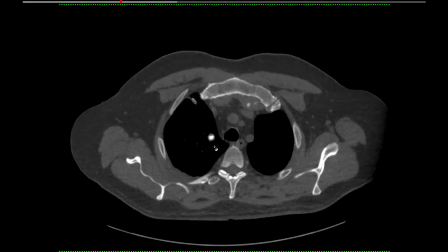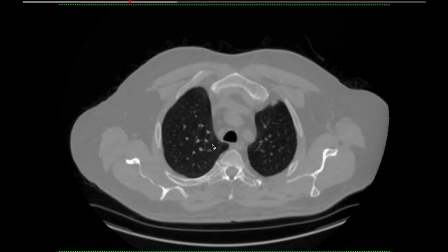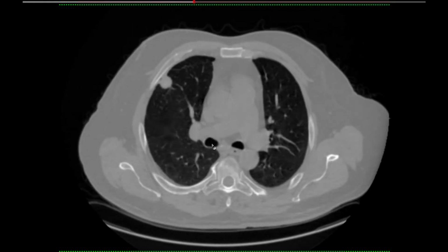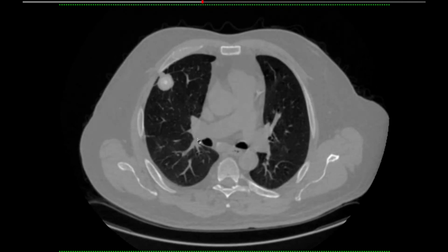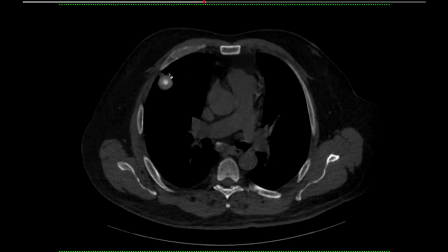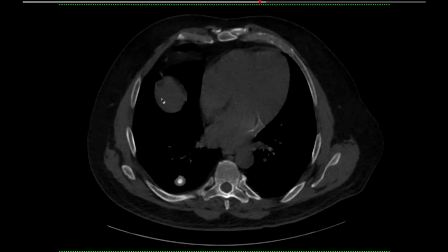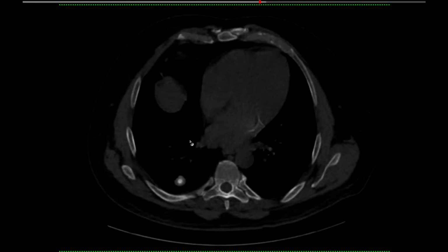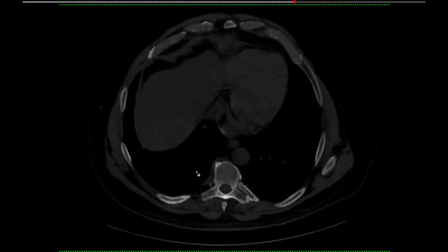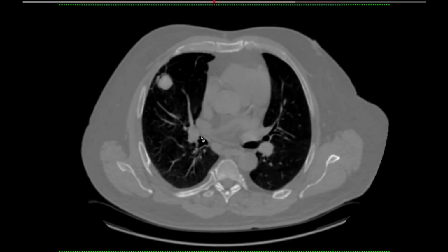Okay, so I'll show this case first because it has nothing to do with the other ones. I don't know why my PACS always exports only the lateral. You can see some nodules here, but the CT is what's kind of cool. As much endemic fungus as we have in the Midwest, we don't see a ton of histoplasmomas. This was cool because this patient didn't have one, but multiple. Here's one here. It's got the soft tissue nodule and the dense central calcification. Sometimes if you window these, you can see they are sort of ring-like. That's a little one in this guy.